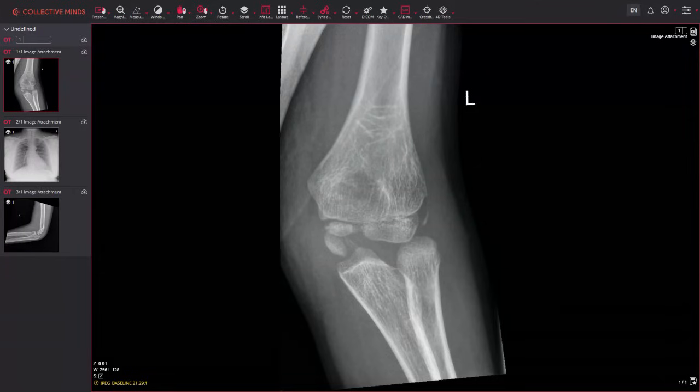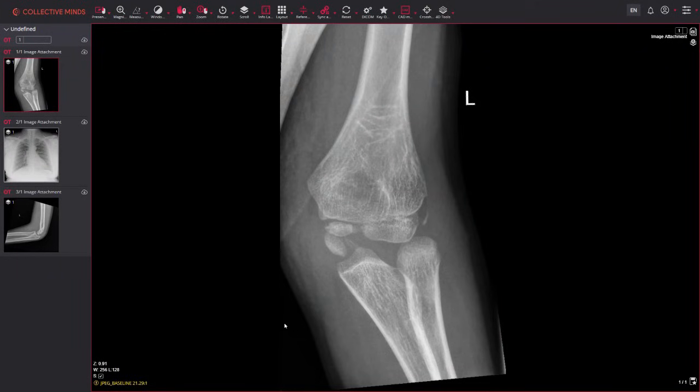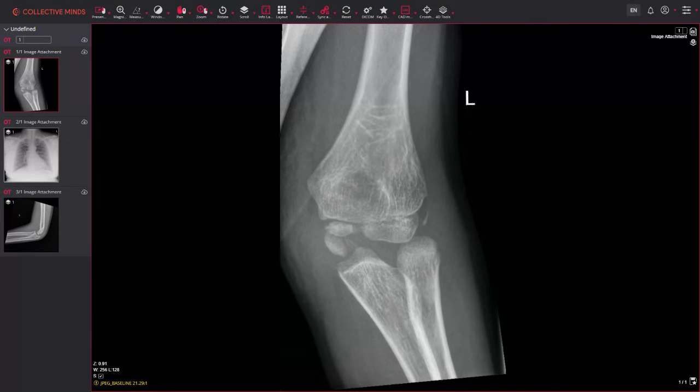Okay, so the first thing that we're going to do is check the patient's identification with that on the indications, because unfortunately sometimes the wrong indications get put in the patient's packet for a number of reasons. So we check the patient's name and the date of birth, and that's usually in this top left or bottom left section here on PACS. Obviously, we've not got it on these to keep the patients anonymized, but that's where you should be looking and checking with the indications. Make sure you've got the right indications as well.